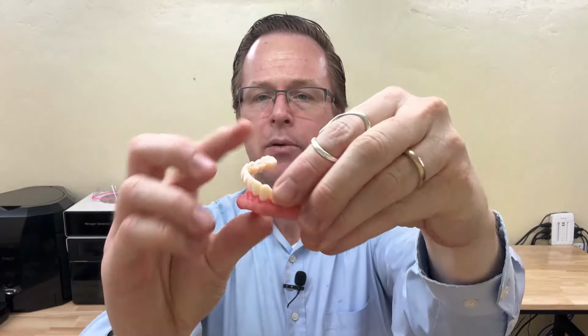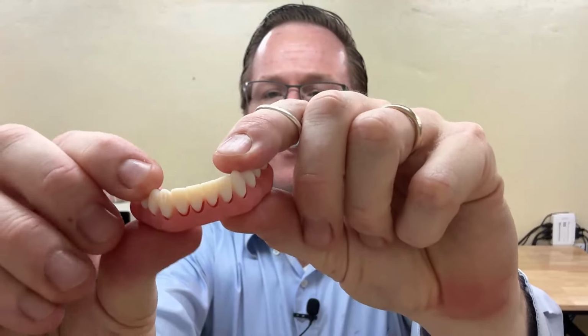So what the coupling angle is going to do is, my ultimate goal is I want to make a prosthesis that looks like this. Fits on my model, looks great. But this procedure is going to give you two independent layers, the one pink and then the one white. So the coupling angle is going to be how these two parts fit together. Is there a path of insertion of these teeth into the pink base?